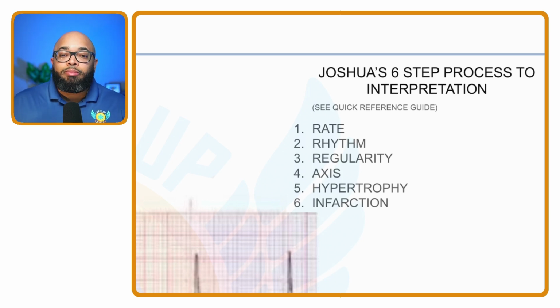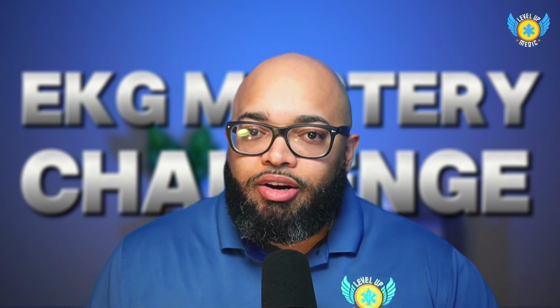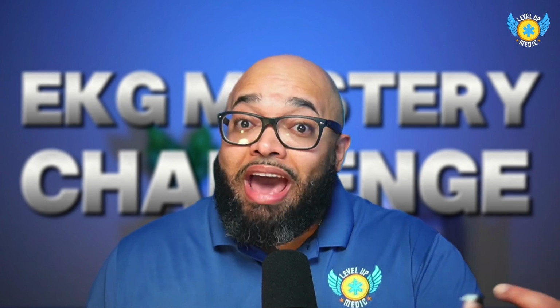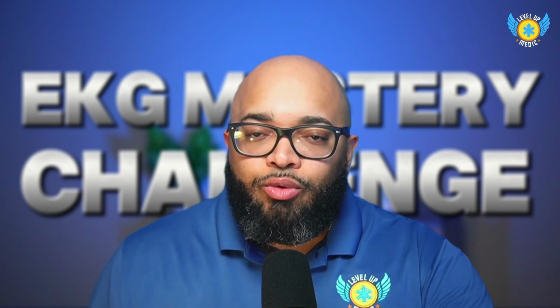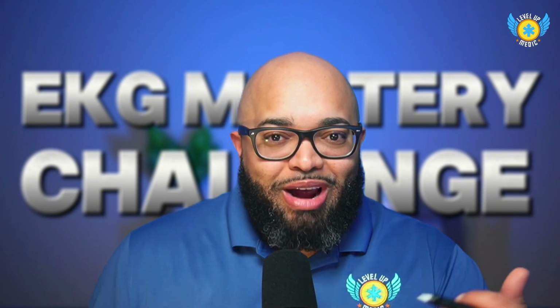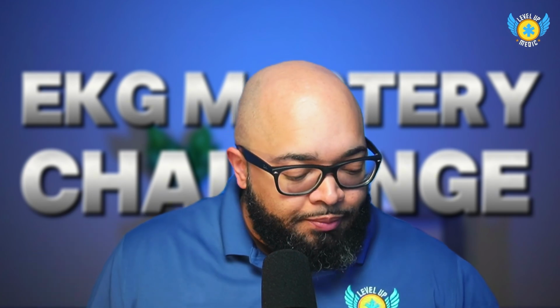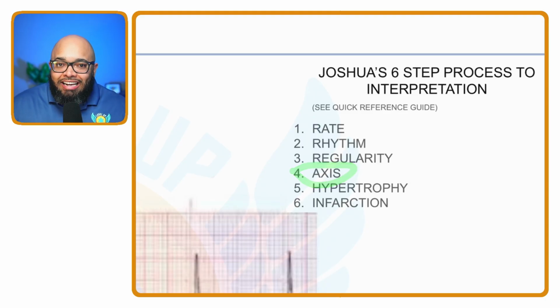Step number 3 is looking for regularity. Is the rhythm regular as we look from left to right? Is everything regular or is it irregular? Okay. And if it's irregular, is there a pattern to it? We call that regularly irregular. And if there's no pattern to it, we call that irregularly irregular, like AFib, VFib, any kind of fib, right? Those are irregularly irregular.